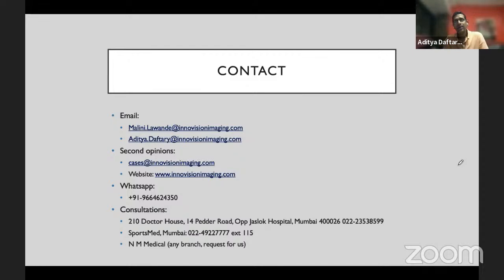As for TR and TE on an image, there's a bunch of numbers written in the corner of the images, usually on the first image of the study. Oftentimes the imaging center will just put a sticker on the study saying it's a T1 or T2 study. But if you look at the small numbers, you'll see a number that says TR and TE. That will help you determine whether it's T1 or T2 weighted. Now, the exact time for MRI is anytime. I'm happy to read them all the time. But like I said, 48 to 72 hours would be ideal.